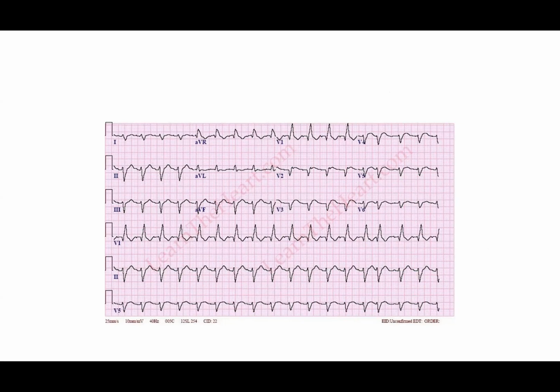So let's just do one more time a bundle branch block check, just to kind of speed things along, right? If I told you it's a bundle branch block, what type of bundle branch block is it? You look at V1, V1 is positive. Notice this doesn't have the RR thing, right? It's just one R. So it can be either or. So don't rely on those bunny ears that we talked about because they might not always be there.